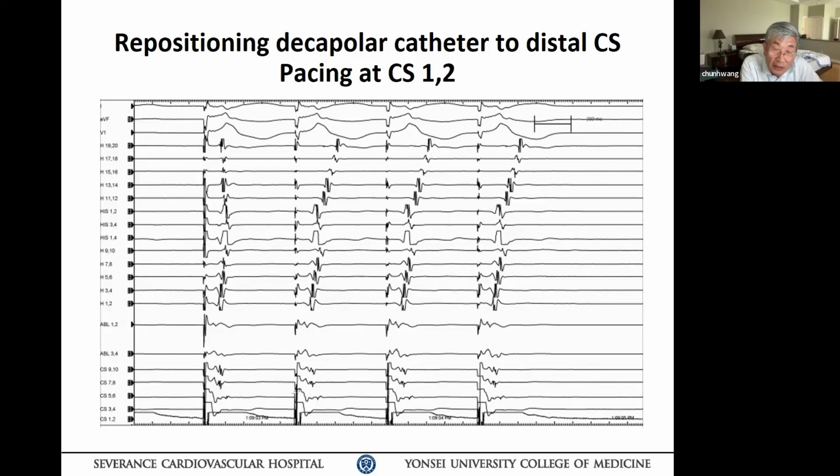If you look at the epicardial pacing you mentioned, actually a pathway is somewhat of an epicardial structure. If you look at Becker's histologic studies from the early days, they are basically just underneath the AV junction, the annular junction, and mostly toward the epicardial side. The annulus itself is intact. They don't have any defective annulus. So this fiber should be close to the coronary sinus muscle. The only trouble that I see from time to time is that this muscle has epicardial fat tissue and also atrial muscle thickness.